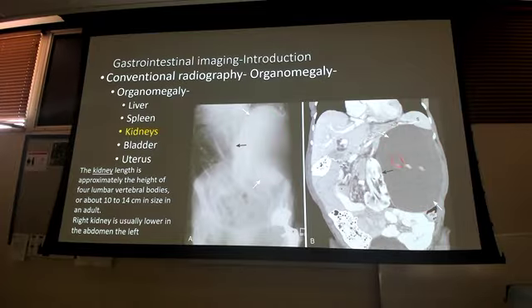But can I tell that from just x-ray? No. I see some kind of mass. I see some kind of enlarged organ. I see this giant radio-opaque thing that's not supposed to be there. All of my bowel gas is being pushed out of that entire side of the abdomen. That's my indirect evidence. I don't know why. What's my next step? I'm ordering a CT. I find a kidney that's being compressed from a giant cyst.